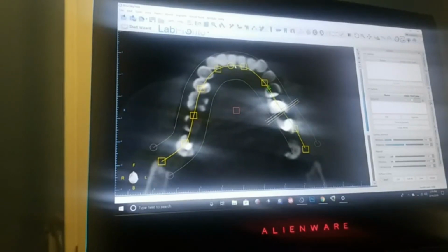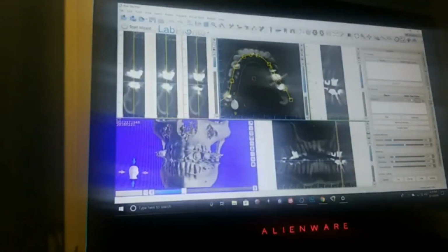What this means is this line that's running immediately in this area corresponds to this image of panoramic that you have here right now. Okay, now watch what I'm going to do one more time. Take a look and see how we're going to change this. I'm going to press a button again, and things are going to change back to the original image.